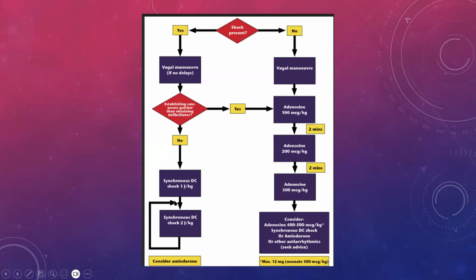I'm going to put up that link to that video, and I would suggest you watch it. It's just about 4 minutes. They show you exactly how they do a synchronized cardioversion, and it's very easy. Once the synchronized cardioversion is done, now don't worry about this, on an adult, you start at 100, then you go to 150, and then you go to 200, although in my experience, 100 or 150 is normally more than enough.